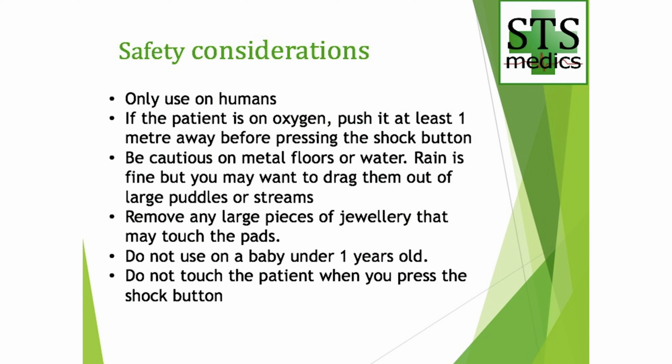Here are some safety points. Only use on humans. If the patient is on oxygen, push it at least 1 metre away before pressing the shock button. Be cautious of metal floors or water. A bit of rain is fine, but you may need to drag them out of large puddles or streams. Remove any large pieces of jewellery that touch the pads. Do not use on a baby under 1 year old, and do not touch the patient when you press the shock button.